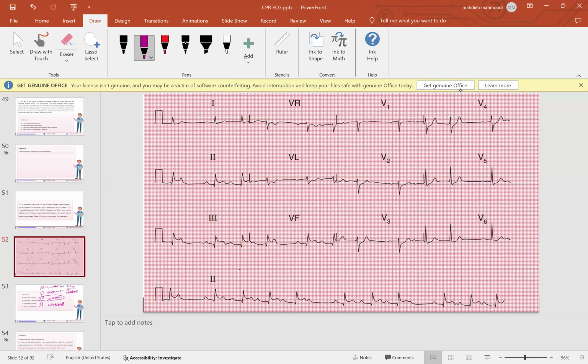First degree. Yeah. There is first degree heart block. You can see PR interval clearly long, increasing. Anything else? Okay, so tell me something. This PR interval, is it the same as this PR interval?